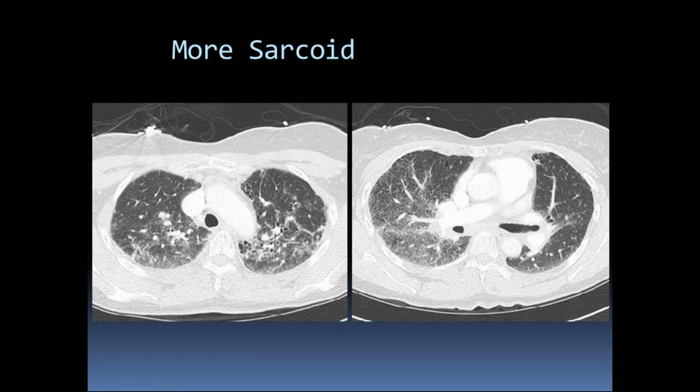All right. Moving on to another appearance. Here, again, upper lobe distribution. That's what you're going to run into most often. It's not very often predominantly in the lower lobes, but you can see on the right image that there are tiny nodules pretty much everywhere.